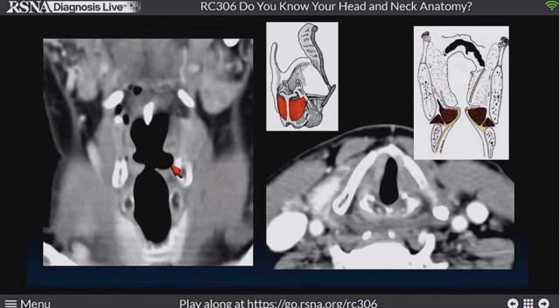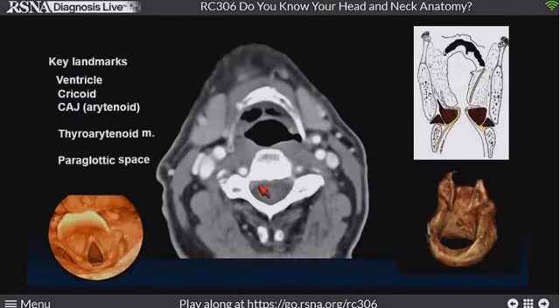So you can see that on the back of the cricoid with a vocal cord paralysis, but most of the things are really because the thyroarytenoid gets so small, the ventricle gets big, and so that's the real thing most people usually see. But we like to emphasize, here's normal, this is fatty infiltration of the posterior cricoarytenoid.